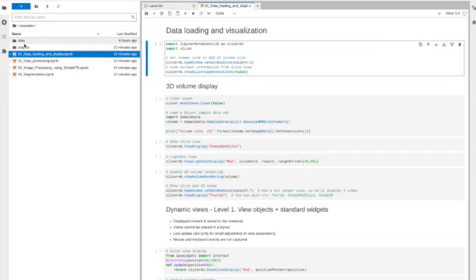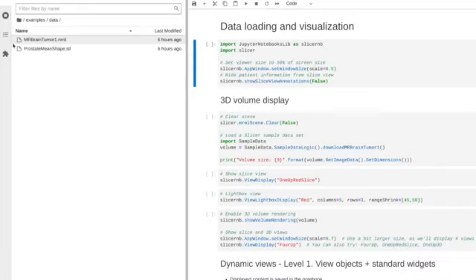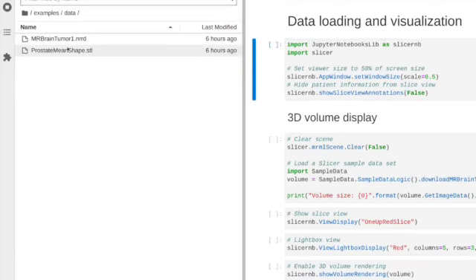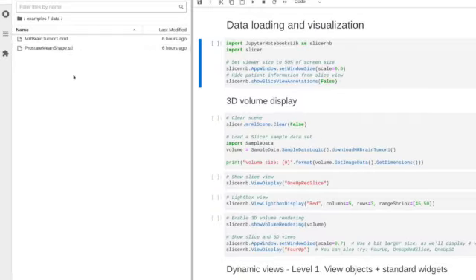By the way, on the left side here, there's a data folder. It's pretty much just using 2 data types, and the main one we're going to focus on is MRI for brain tumor. It's already been ingested. Typically, you would get the data in a raw DICOM image format, and there would be a whole bunch of them. So this actually is 1 step further down the loading part.